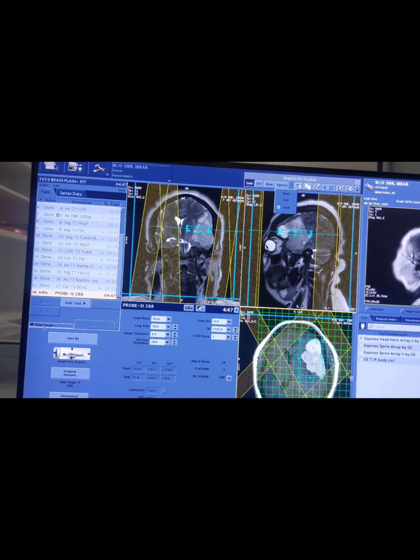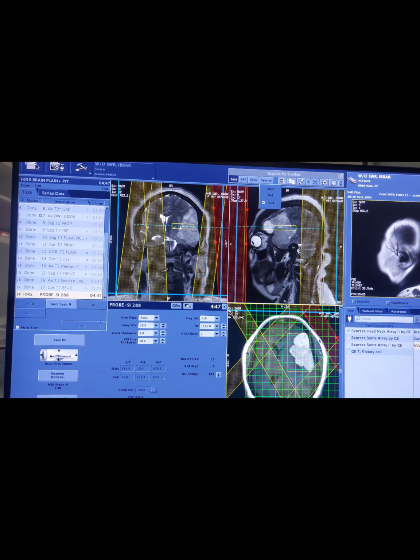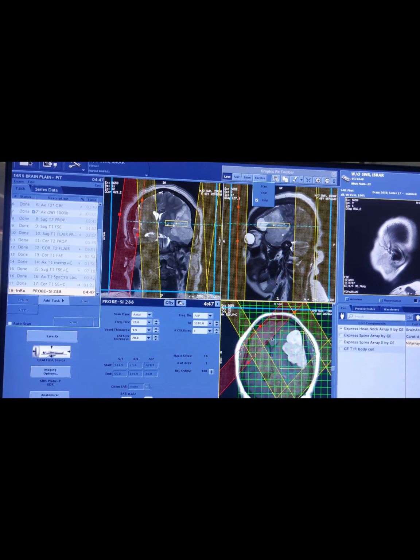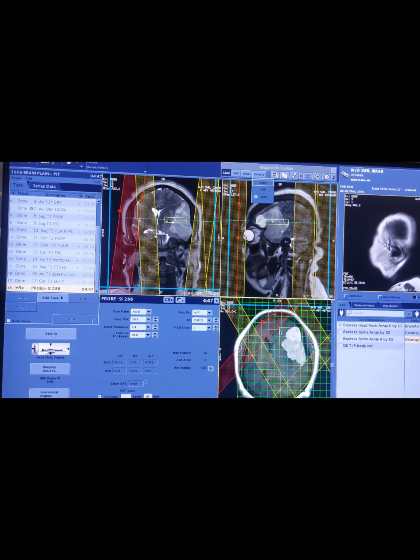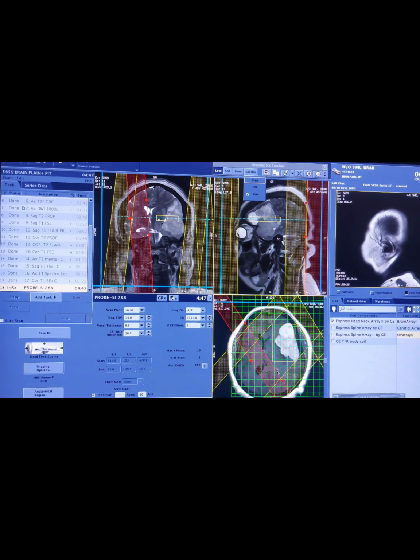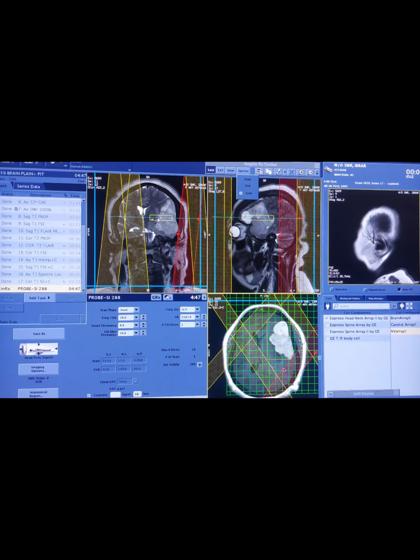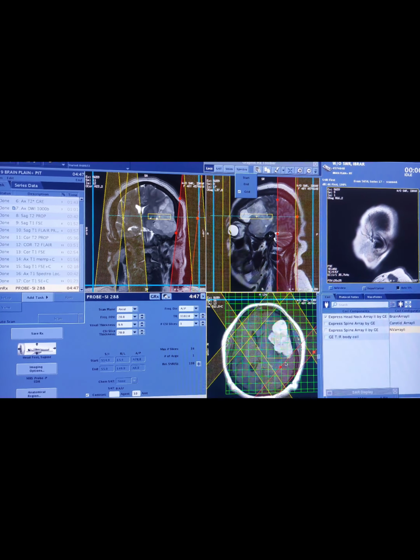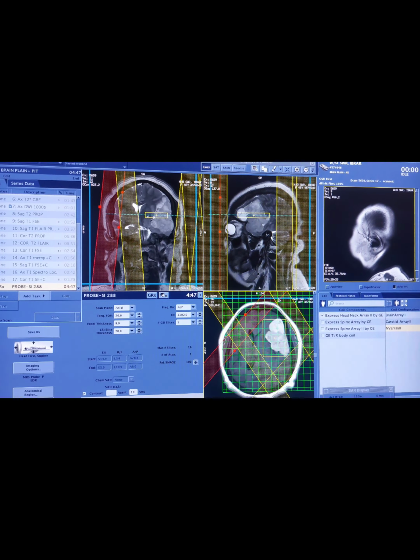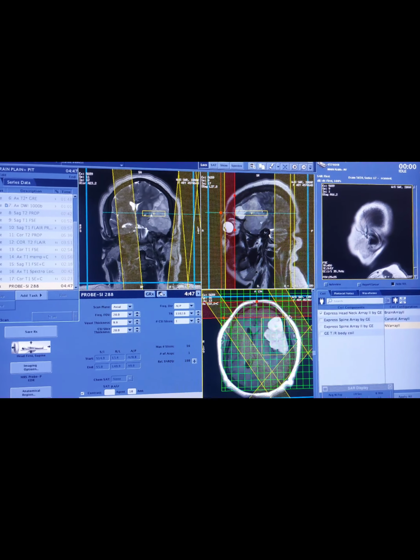Okay, now we will proceed, and the most important thing is the saturation band. We can arrange saturation bands in two different ways. One is covering the brain and joining the corners of the spectroscopy box like this, and another way is to make them parallel to the four sides of the spectroscopy box, whichever you like.